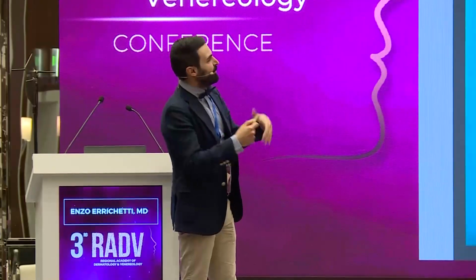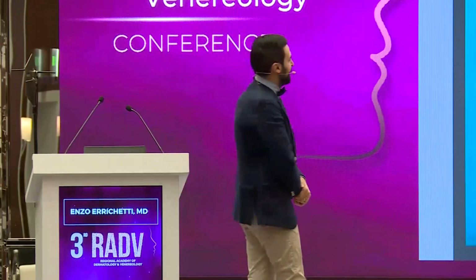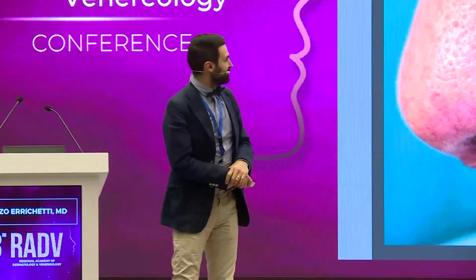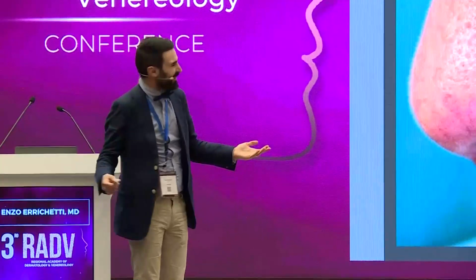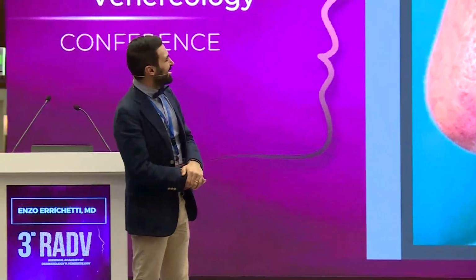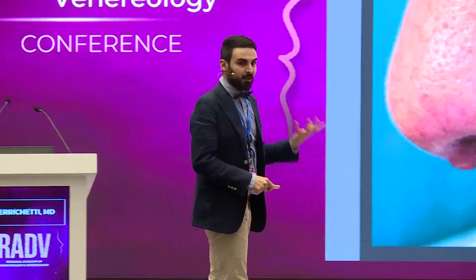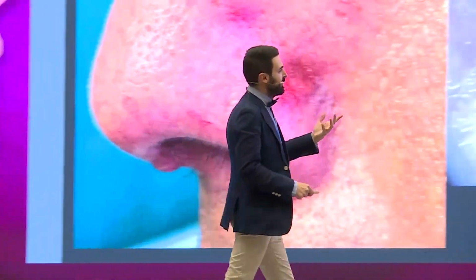Okay, so let's practice. Do you have an idea about the diagnosis here? Single lesion. Sarcoidosis, yes, of course. Sarcoidosis may look like everything, so it's never a mistake. Let's take a look at dermoscopy. We have orange. We have plugs.